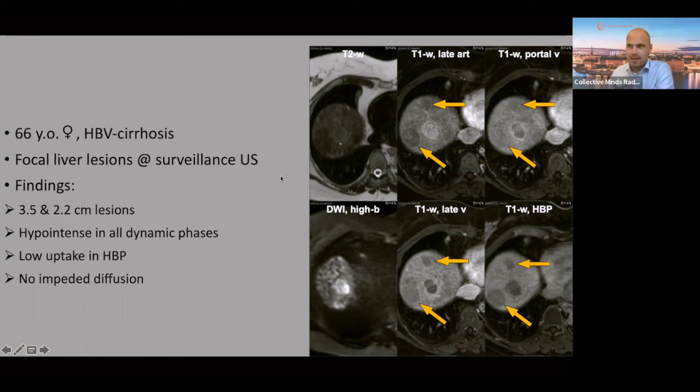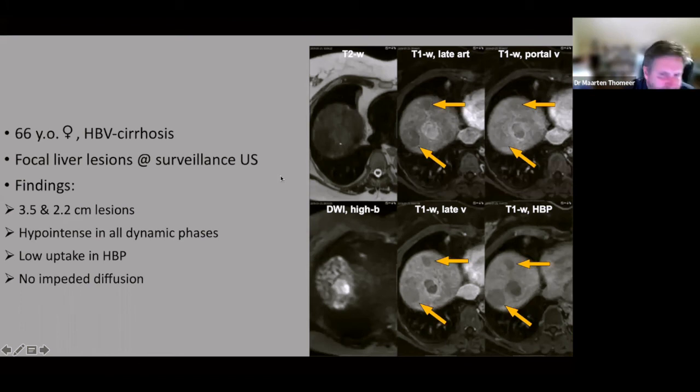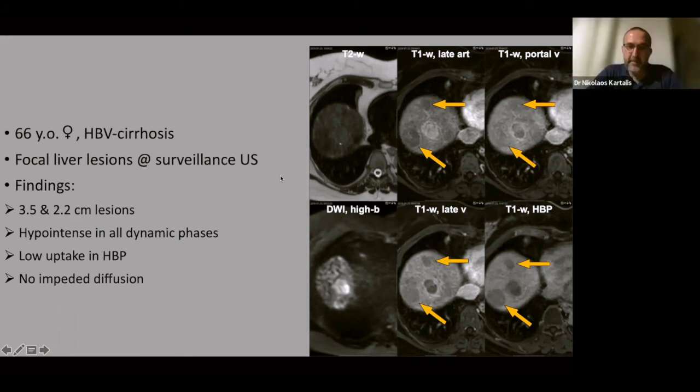Yeah, so we're still getting some answers, but they are very consistent, I would say. So there's also a question. There's somebody thinking maybe, could it also be a rim enhancement with rim washout in this case? Meaning in the other hypervascular tumor, I think, the center. Is it why we call it an HCC? Is it not cholangiocarcinoma because there's a rim enhancement? Actually, this is rim washout. It's really not peripheral washout. I wouldn't say. No, the hypervascular tumor.